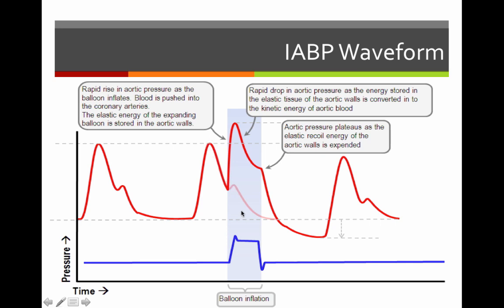And come into our diastolic portion here, and our aortic balloon's going to inflate, increase the pressure once more, and this is going to push our blood into our coronary arteries. We're going to have this assisted, kind of dicrotic-notch-ish plateau right there. And then we're going to come right back down. So as that balloon deflates, again, we're decreasing afterload, and you can see that.